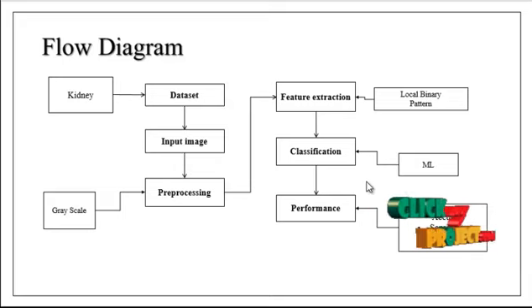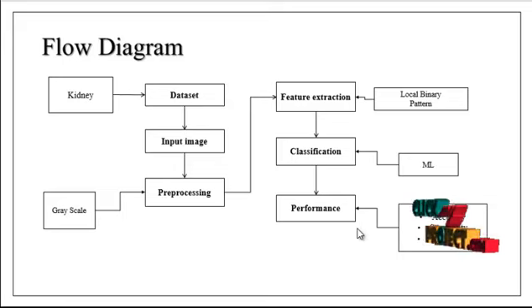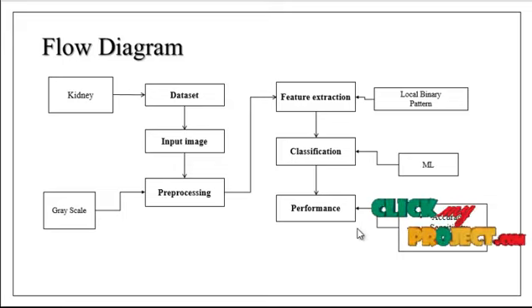After doing the classification, the performance estimation will be carried out. In this performance estimation, we have three kinds of performance measures: accuracy, sensitivity and specificity. Majorly we have concentrated on the accuracy. In case the accuracy is high, the precision of the performance is high.